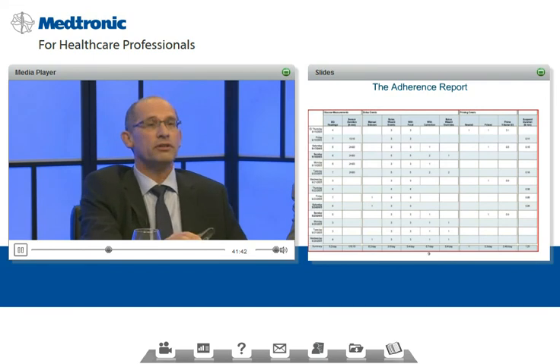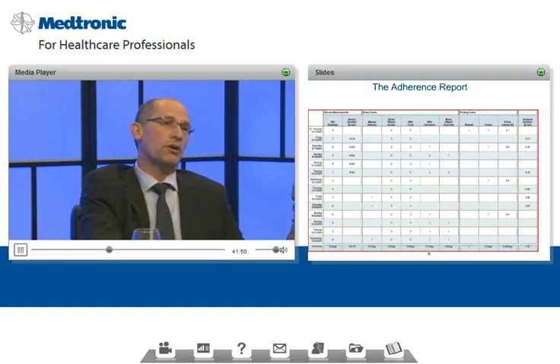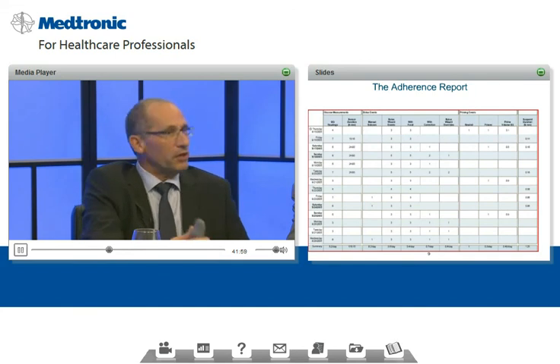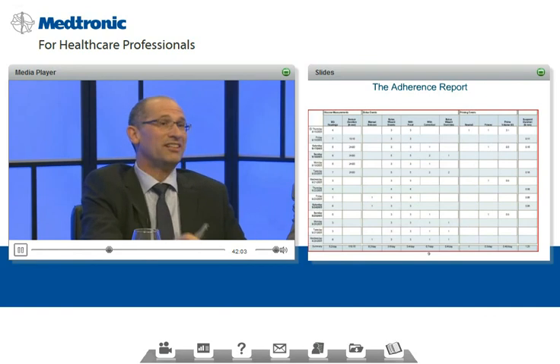The override part is also very interesting because that tells us the amount of belief the patient has in the recommendation of the Bolus Wizard. If the patient always overrides what the Bolus Wizard recommends, it's not good. That means maybe he is right, or maybe the recommendations are wrong and you have to change the settings.